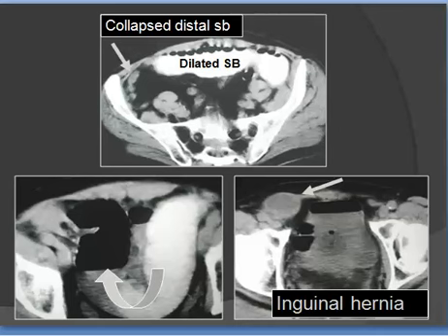Dilated loop, tortuous with fluid level. The cause here in this case is inguinal hernia. See, the loop is directed here towards the hernial site, and this is the part of the loop outside the anterior abdominal wall, and this is intestinal obstruction due to hernia.